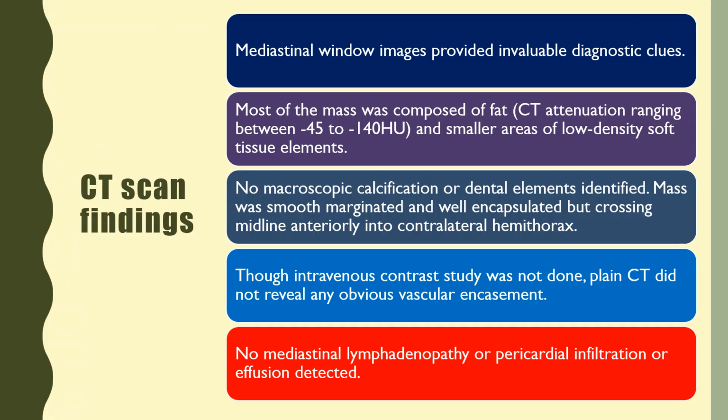So the mediastinal window images provided invaluable diagnostic clues. Most of the mass was composed of fat, with CT attenuation ranging between -45 to -140 Hounsfield units, and smaller areas of low density soft tissue elements. No macroscopic calcification or dental elements were identified.